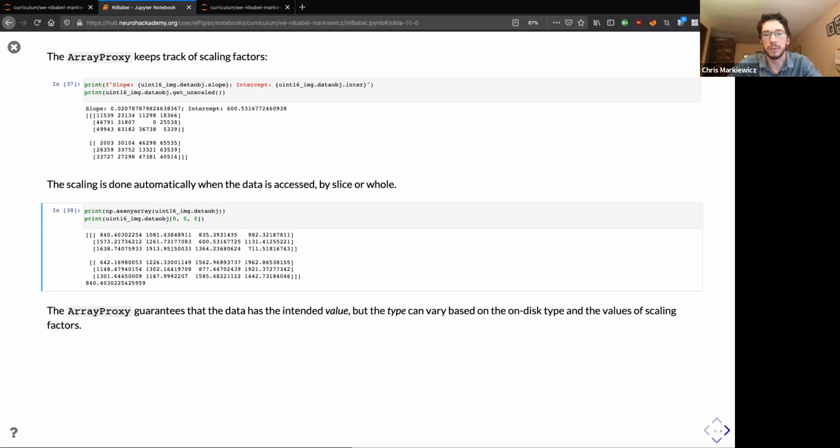Previously, what we gave you was equivalent to this as any array. And so if I had ints and there was no scaling, I would get ints back. But if there was scaling, suddenly I'd be getting floats back. And so if I write software that works on my data and then you give me data that's encoded slightly differently, sometimes I get confusing results, and it's a little bit subtle how you got there.